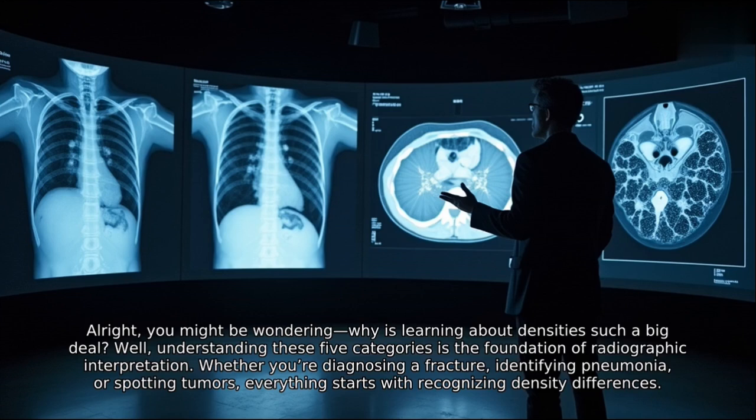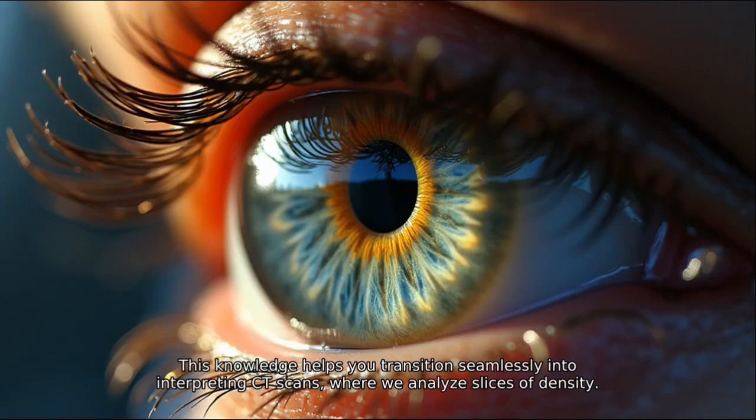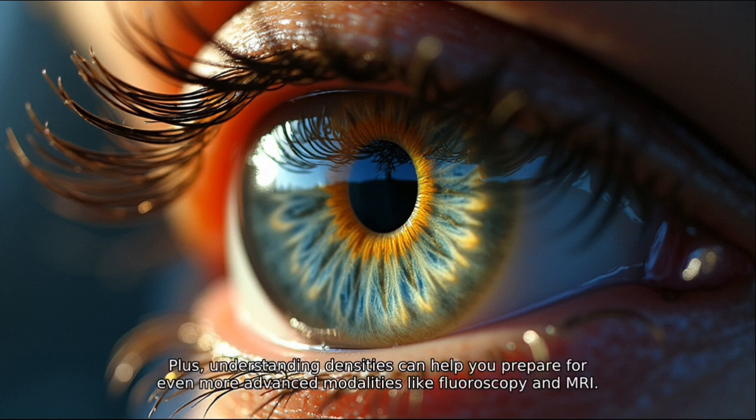All right, you might be wondering, why is learning about densities such a big deal? Well, understanding these 5 categories is the foundation of radiographic interpretation. Whether you're diagnosing a fracture, identifying pneumonia, or spotting tumors, everything starts with recognizing density differences. This knowledge helps you transition seamlessly into interpreting CT scans, where we analyze slices of density. Plus, understanding densities can help you prepare for even more advanced modalities like fluoroscopy and MRI.